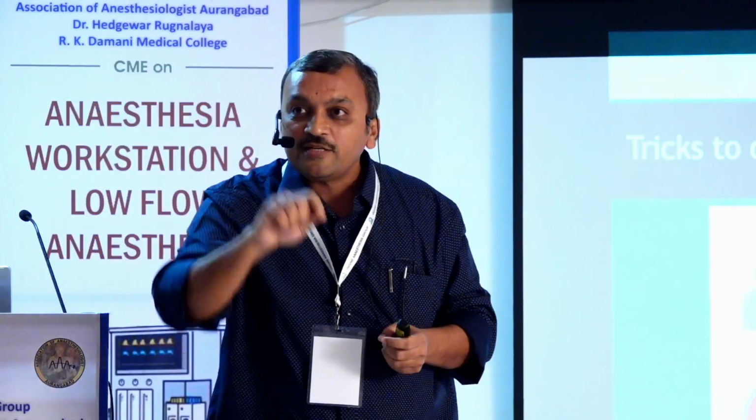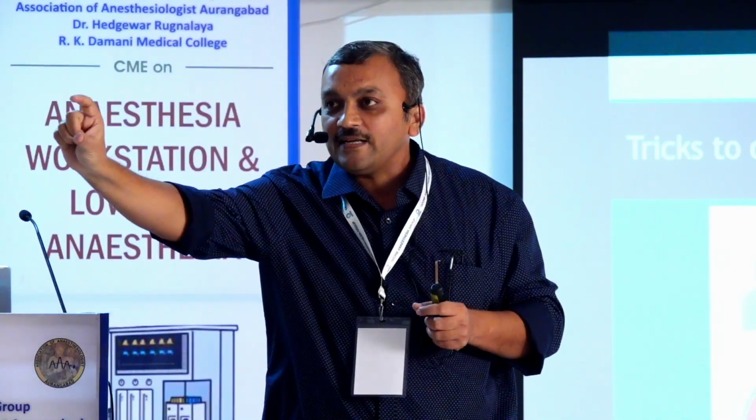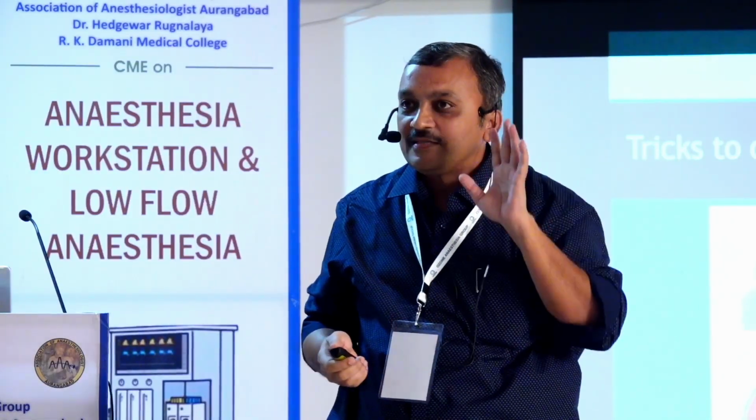But the moment you do it on auto scaling, that graph will automatically adjust, and you will still see that, yes, the graph looks fine. So if you set a fixed scale, even from afar you will be able to identify that certain things are wrong, isn't it?